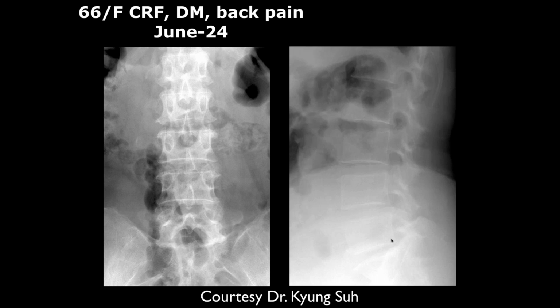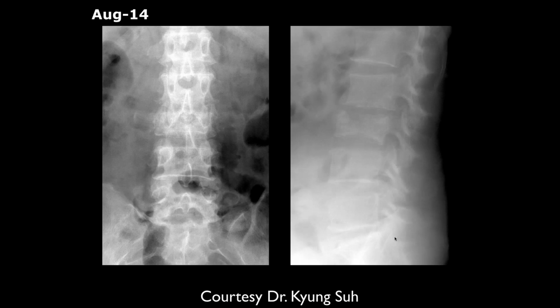66-year-old female, CRF, chronic renal failure, diabetes, back pain. So we have AP and lateral views of the spine. So this is on June 24th. Here's August 14th.